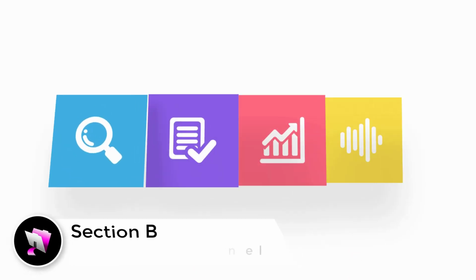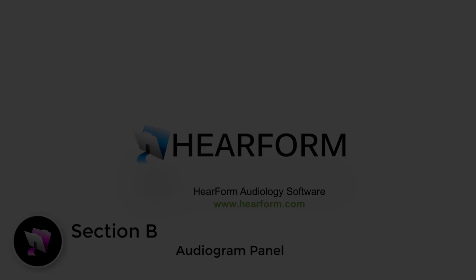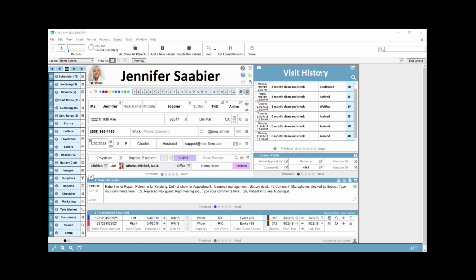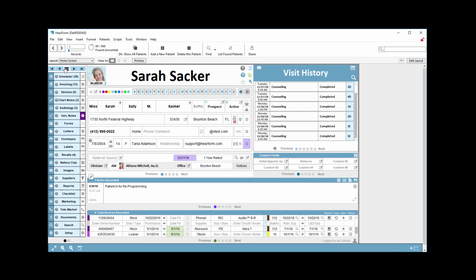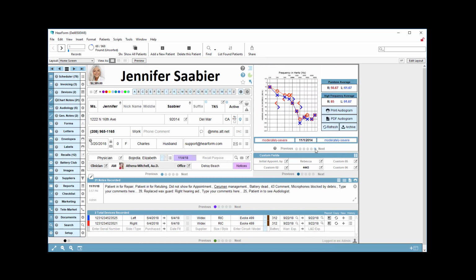Welcome back. This video will explain how to work with the Audiogram panel in Section B. By default, the Visit History panel is going to be seen when you first open the program and as you scroll between patient records here. However, if you want the Audiogram panel to be your default, just contact support and we'll change that for you.